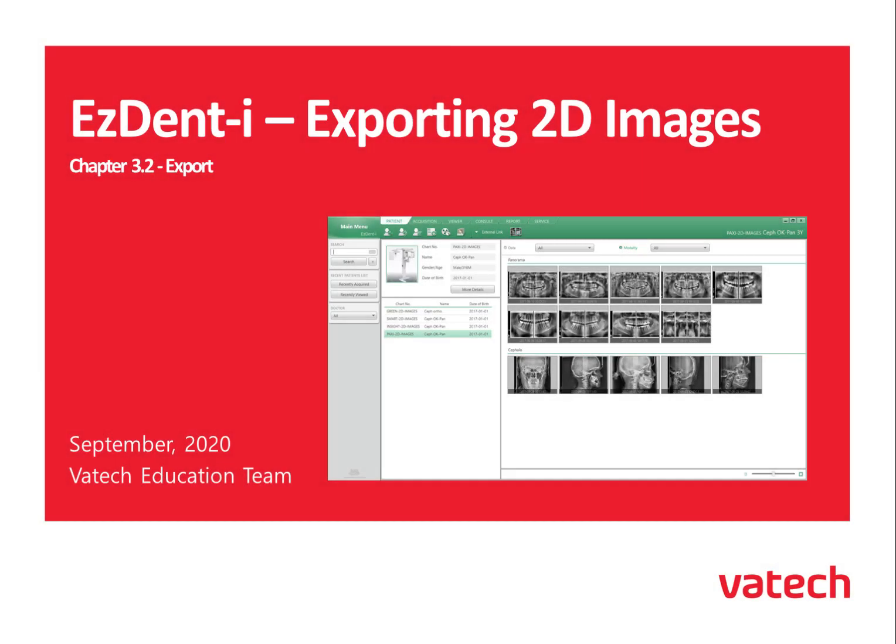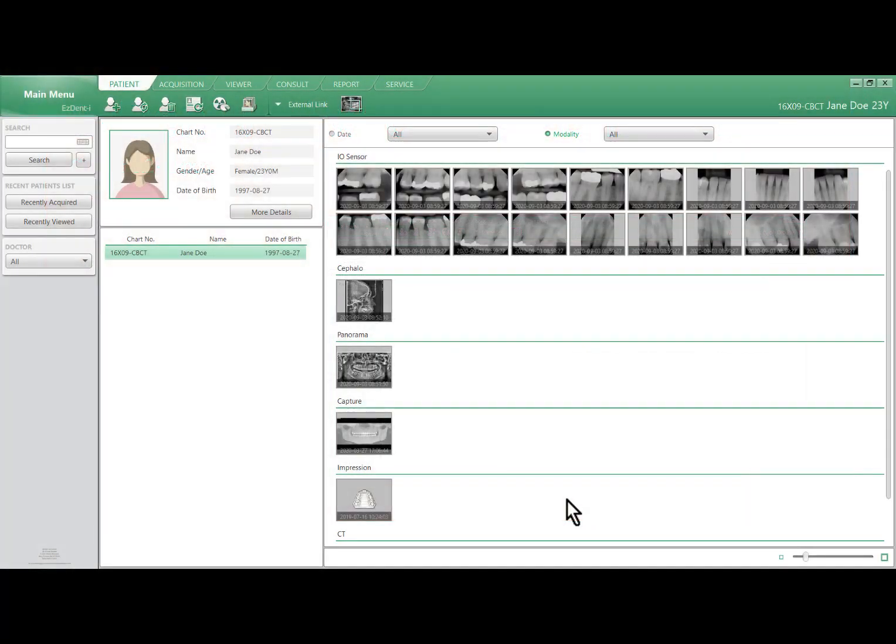EzDent-i, exporting 2D images. In this video tutorial, we'll go through the steps to be able to export images from a chart, whether it be sensor images, a cephalo image, panorama, or even a capture image.